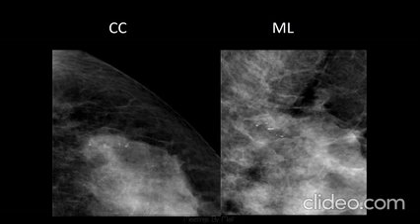So here's a nice example on CC. Here she has a few round and amorphous calcifications. Not only do they change shape, but all of them crisp up. So those few that were amorphous are now more easily seen. You're going to notice they're never all going to layer perfectly, right? We just need a sampling of them to do that.